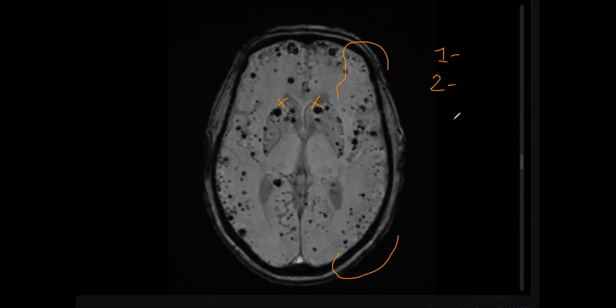Other differential, most likely if the patient is hypertensive, but hypertensive bleeding will be more at the central basal ganglionic region, so it doesn't explain this. Okay, no problem. We are talking, trying a discussion. I'm trying also to make up what could present so much.